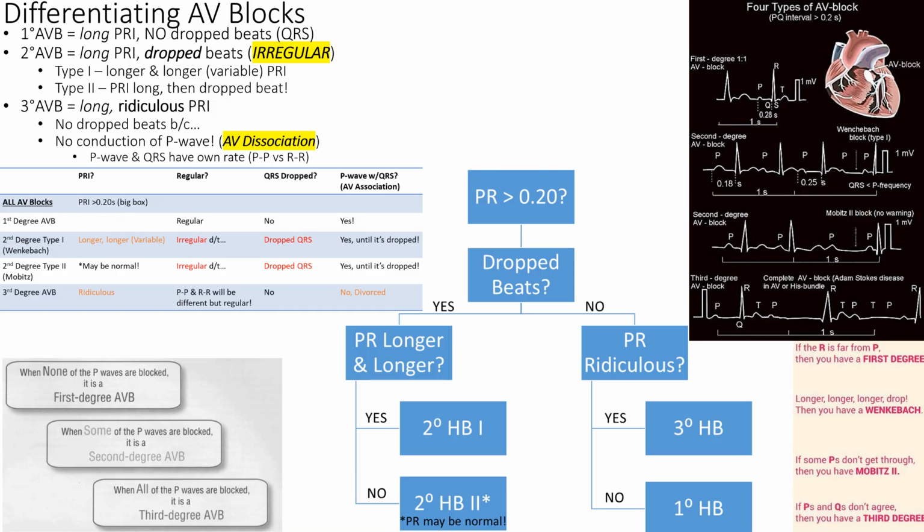So then there's a little summary of all the different AV blocks we've just been talking about. We have our little table here, right? You can add on treatments on the side over there. Usually we're going to give what first? Atropine. We'll try atropine. And usually it's not going to be effective once you start getting down to secondary type 2s, and definitely not effective when you have third degree AV block, because third degree AV block means that we have no AV node activity. Okay? So the next thing we have to do is start pacing them, right?